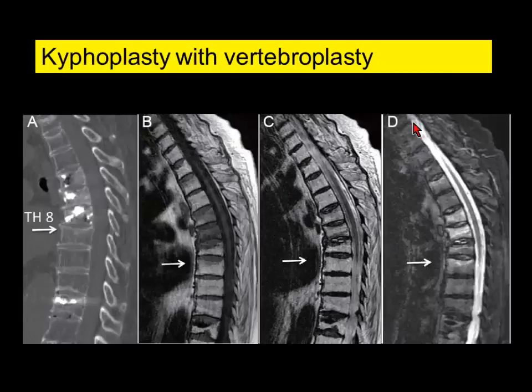Now, I've got a spectrum of MR. So T1, T2, and T2 fat sat. So the fat has been suppressed. So when you suppress the fat, then marrow has got fat, it also suppresses. Anything which remains white is edema. So looking at it, there are multiple fractures. Again, the importance of what is acute, what is subacute, you don't know. Here is also edema, there is edema here, there is edema, but which one is causing pain? There is marginal edema there, superior end plate. So multi-level fractures. There is no compression of the cord, which could be another cause of the pain.